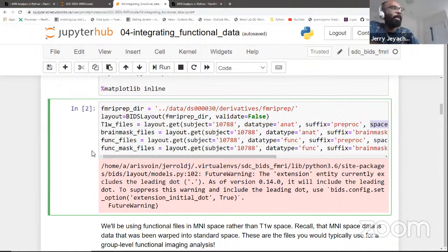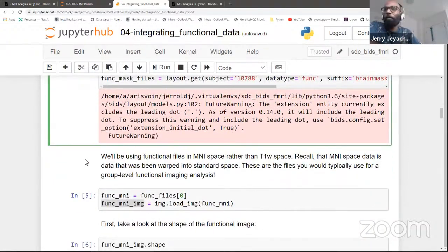Okay, so I'm going to move forward. Again, we have helpers who can help you out. And maybe this would be an opportunity to get the screen sharing for the guests so we can live debug. I'm not sure if that's possible. Let me know. All right, so we're going to move forward. Again, the solutions have a slightly different version of it since we've deviated a little bit, but it'll still work the same.